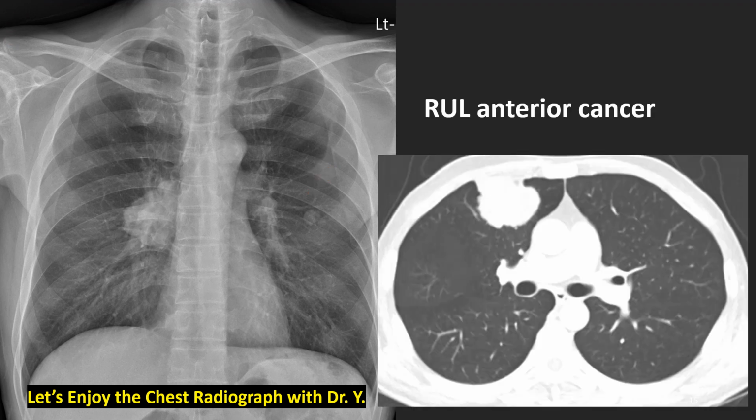Lung window setting of axial chest CT. This is the result. Right upper lobe anterior segmental 4 cm lung cancer, not overlapped with the hilum, separated from the hilum. That's the hilum overlay sign and silhouette sign, not hilar pathology.